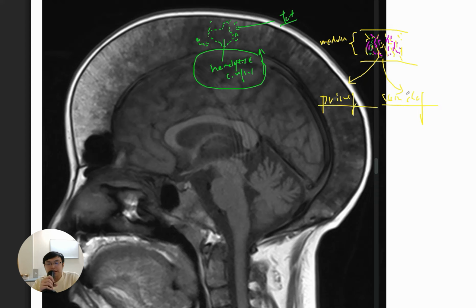So basically, we have different types of trabeculae, and both of them should be present in a normal bone. But whenever we have expansion of some marrow components due to anemia, they will break the secondary trabeculae, and the remaining supportive trabeculae, what we call the primary trabeculae, will hypertrophy.